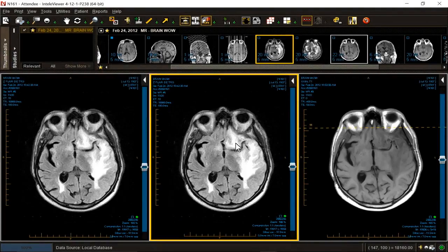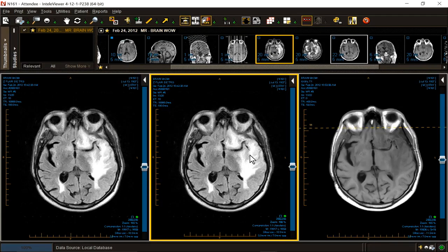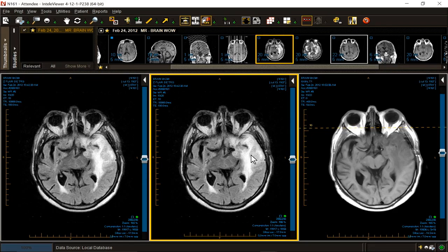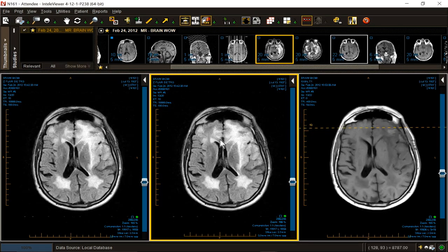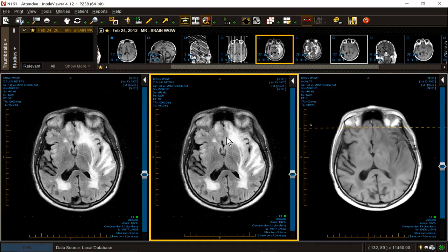My differential would say something like this. Diffuse involvement of the left inferior olfactory, orbitofrontal, frontal, and parietal regions, including the precentral and postcentral gyri, with deep extension crossing the midline and extending all the way to the peripheral margin of the right orbital frontal gyrus, most consistent with an aggressive infiltrative neoplasm. Favor in descending order of likelihood, GBM, oligodendroglioma, anaplastic astrocytoma less likely. Number 2, early uncal herniation. Number 3, no tonsillar herniation.